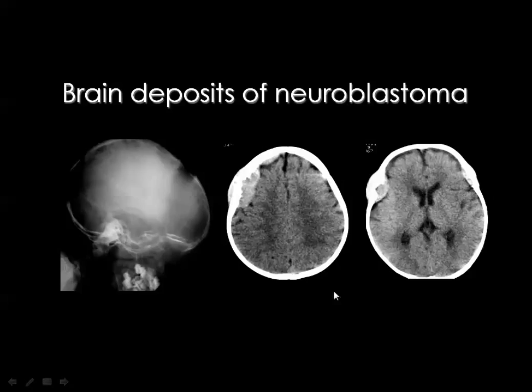And in these areas, you see a mass which is most likely homogeneously enhancing. It has an intracranial component, and many times it also has an extracranial component. And these lesions occur commonly near the orbital cavities, and they encroach significantly on the orbit, resulting in evident proptosis as well.